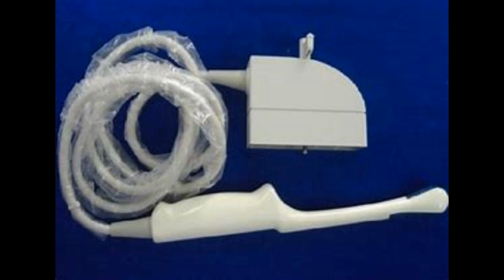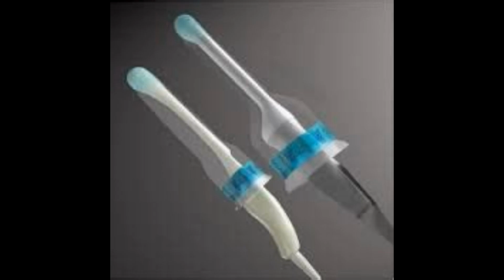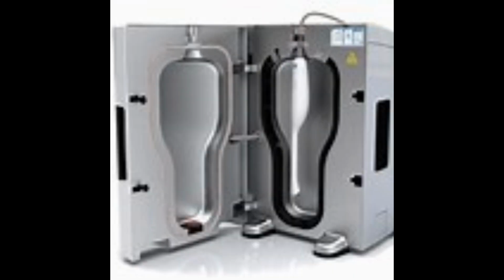Transvaginal probes are essential in any lab that performs OBGYN exams. Since they can get closer to the area of interest, transvaginal probes are higher frequency and higher resolution. When using a transvaginal probe, it's essential to use a disposable probe cover. This is a trophon disinfection device. After the transvaginal exam, high-level disinfection is performed.